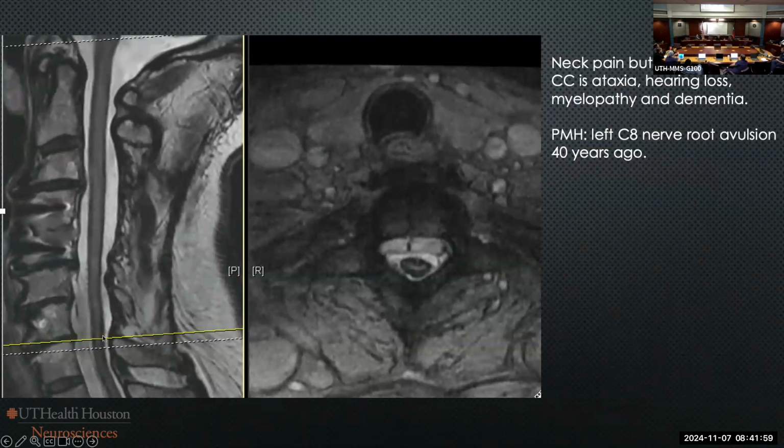When you look at the axial image, you see the epidural CSF being divided into the two compartments by the meningovertebral ligament. But we see something else that's kind of interesting. Notice the cord should be uniformly gray, right? But here it's higher in signal centrally and lower peripherally. So is this edema in this cord, and that's normal signal, or what?